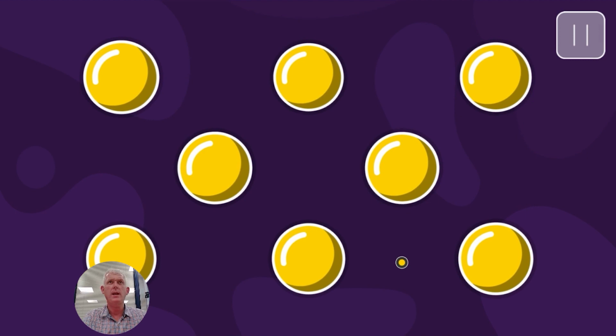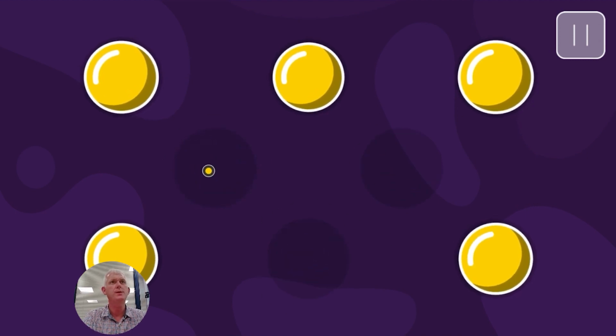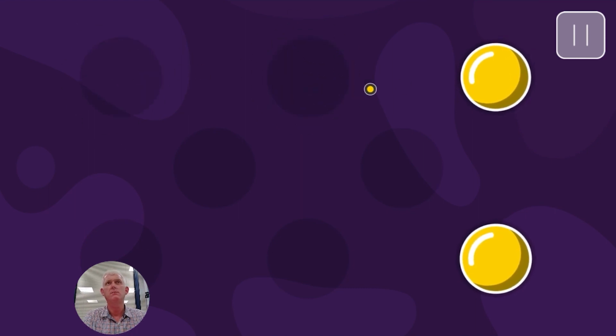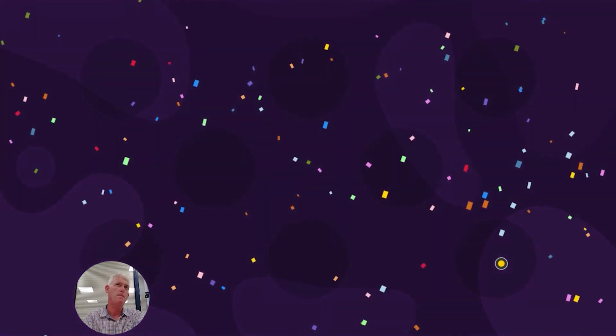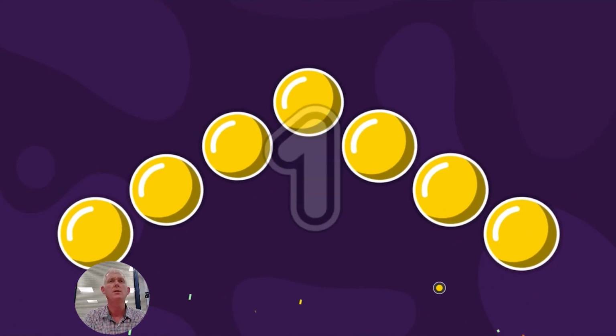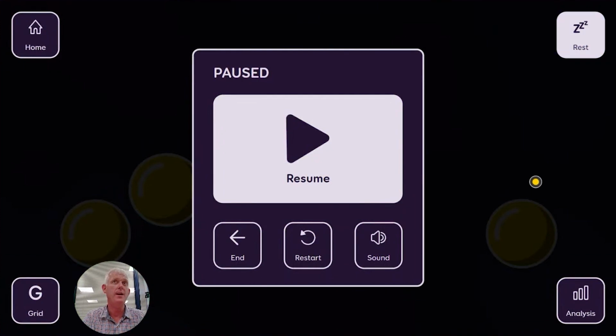Okay, so the idea here is I just have to pop a bubble, so quite straightforward. But one of the things to notice here is I haven't got any busy background. We've removed all the busy backgrounds. And for contrast, you'll also see there, by the way, that the shapes at which I'm being asked to move my gaze point around the screen are changing too.